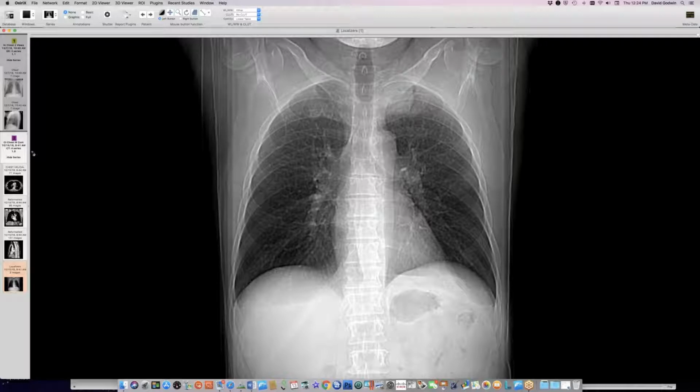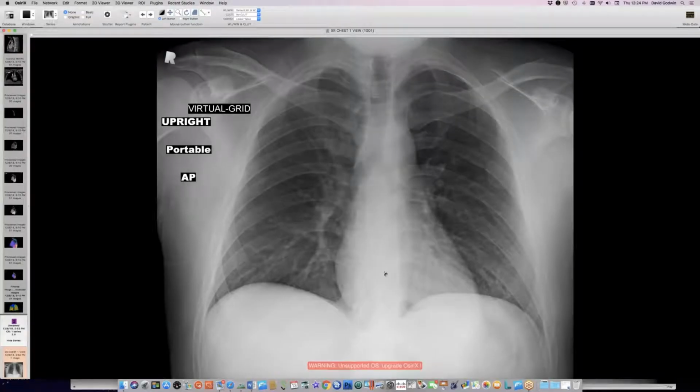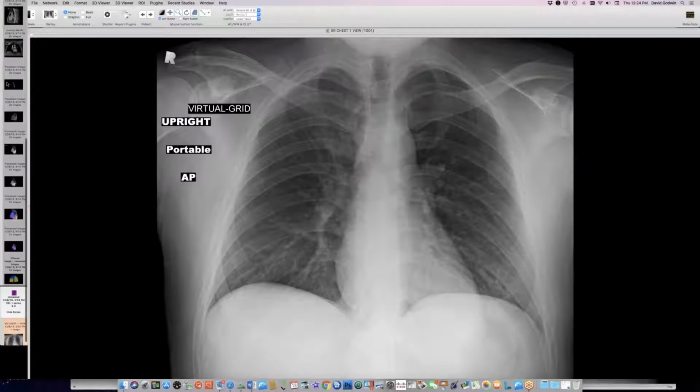So schwannoma in that case. And then here's a case that Eric Stern showed me, and our fellow did a spectacular job of doing three-dimensional reconstruction. This young person was seen at Harborview because of trauma. I think it was a motor vehicle crash, and he has this lucency in the left apex here, and some abnormality of airway here, some dilation of airway, but he doesn't have a mucus plug up there.